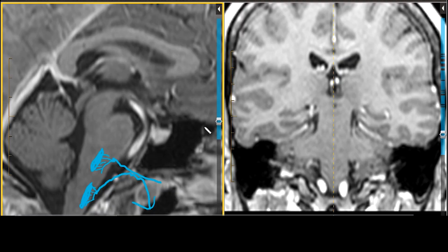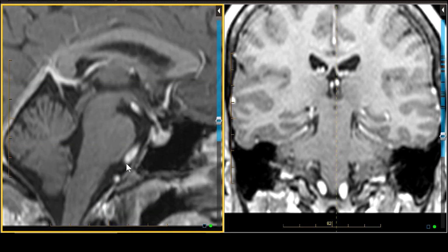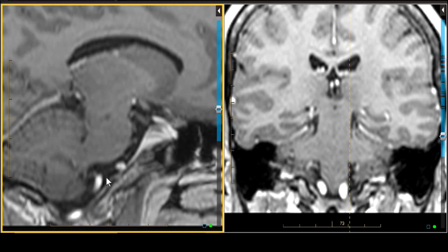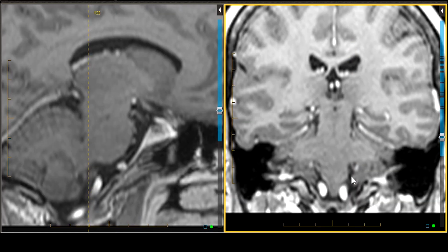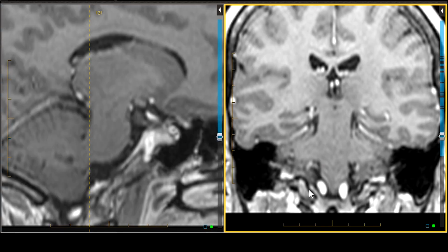So if we look at the coronal projection, we'll take our arrows off now, and we scroll off to the side and try and locate the position of the accessory component of nerve number 11, you can see a little wisp of it right there corresponding to this locus right here. Not so easy to see in the coronal projection because of its diminutive size. You can see its companion on the contralateral right side, and as we said, it loops upward. You can see this one looping upward on the right, where it will join the unseen cranial division of nerve number 11.